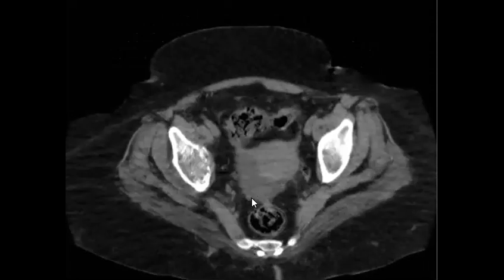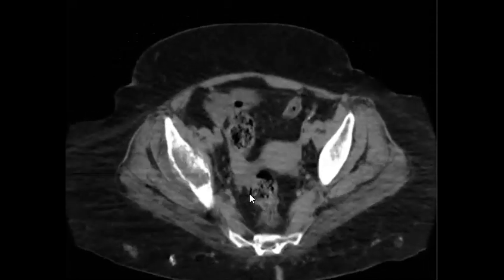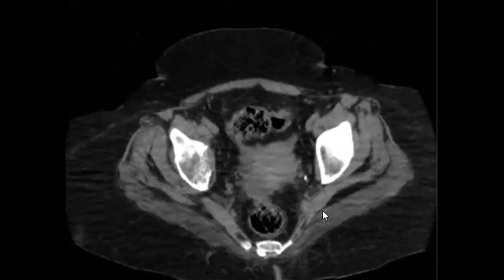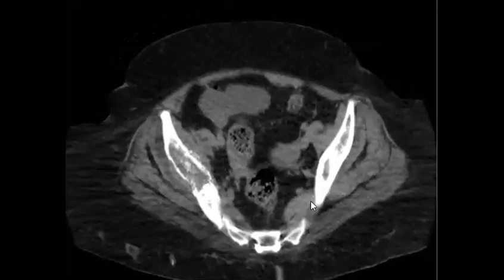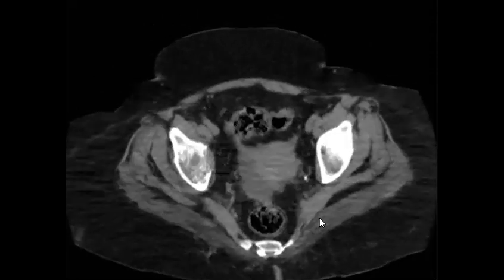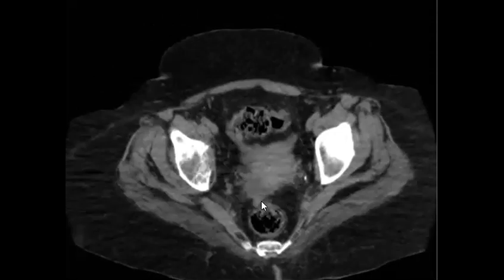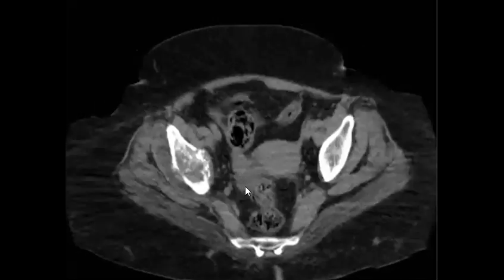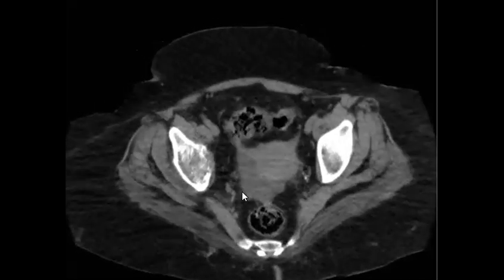So the ovary, go and check the ovary. Perfect. Maybe something there. Maybe. I'm not sure. But yes, I think that there is maybe something there. To be honest, until now this case is not confirmed, but it needs further workup.